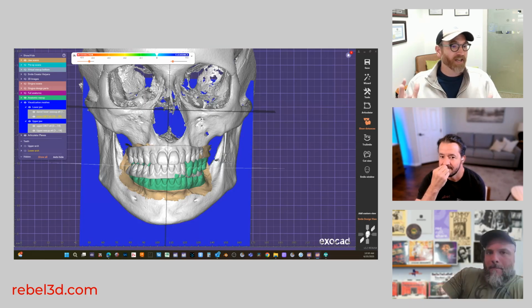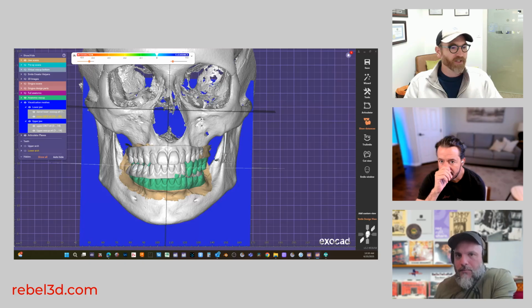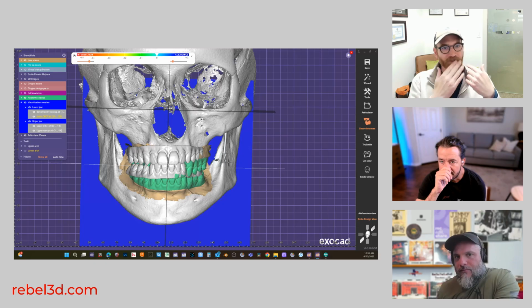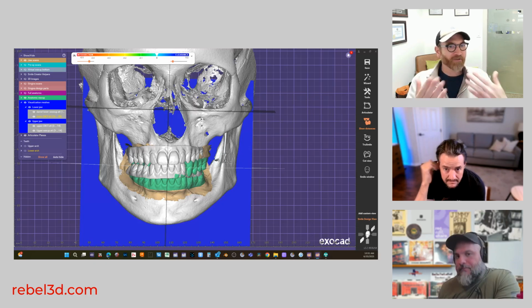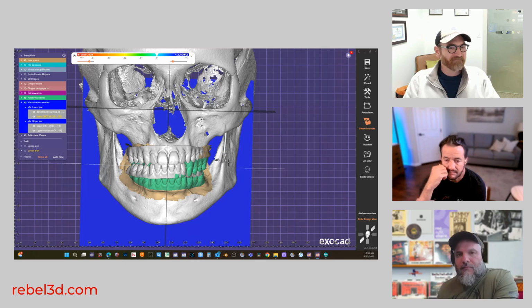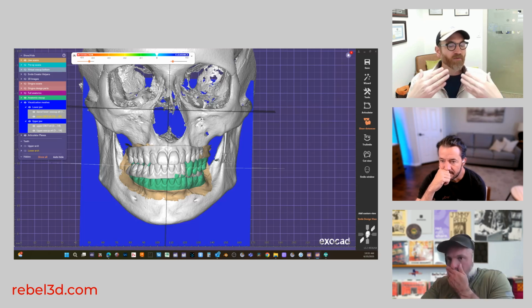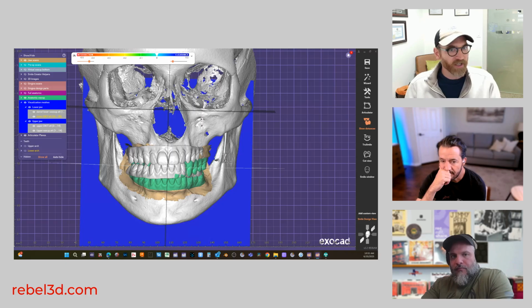Yeah. From a straight up analytic point of view, I agree with you too. It's semi useful, but even with the lip support, it doesn't capture the inside, which is where things are going to be interacting. And so I think you have to go off of what knowledge you have about the patient. And again, that's a clinical decision. Like, hey, this is where I want my 8 and 9 to be. Those are really clinically determined.